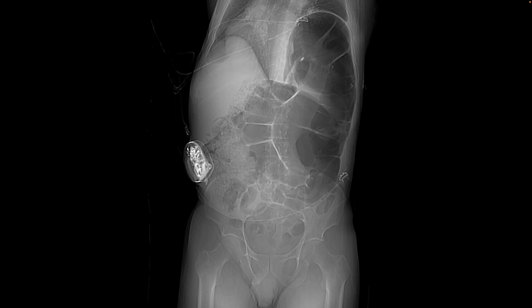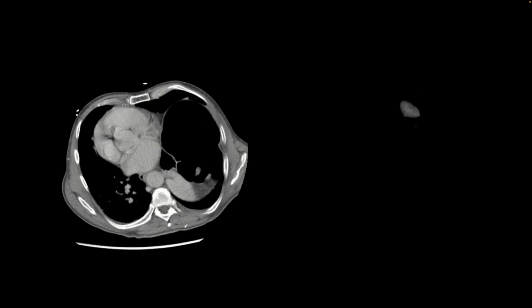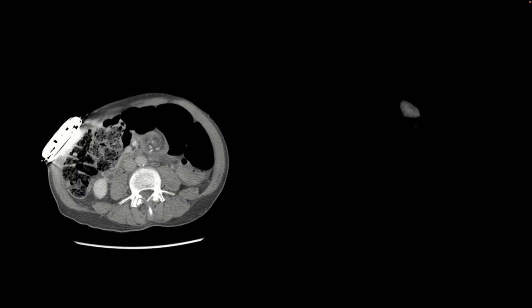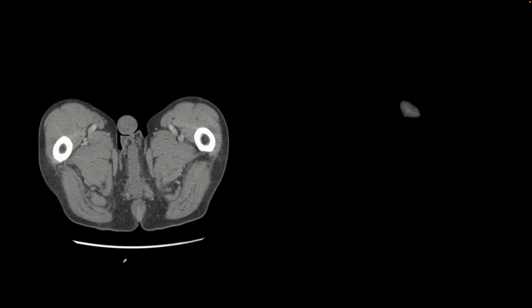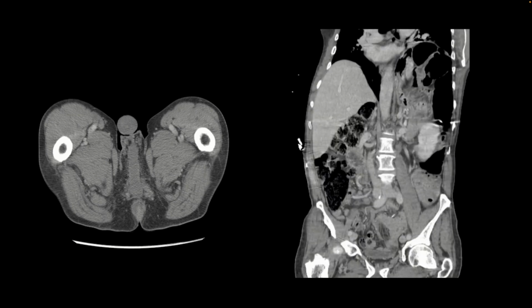Here's our next patient, and they presented with severe abdominal pain, an older gentleman, and we find that there is gaseous distension in this bean-like fashion in the left side of the abdomen and pelvis. And on the CT scan, the findings were characteristic of a sigmoid volvulus. We see right there the swirl in the mesentery. Here are the coronal images showing the same finding.